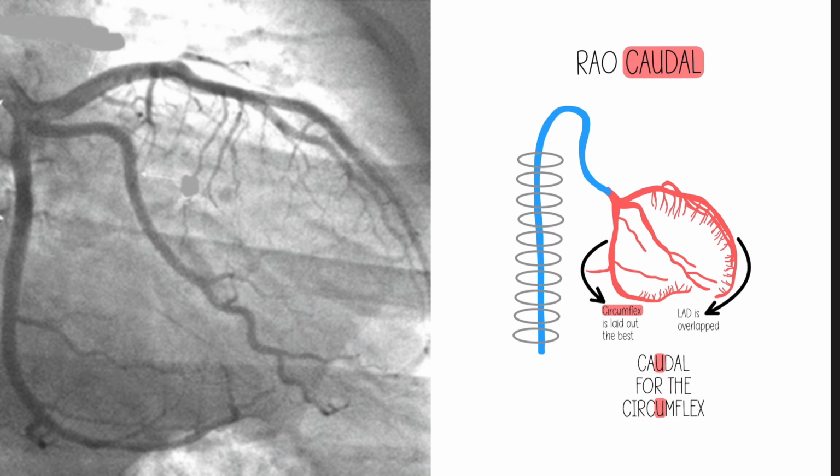It's one of the 4 corners, and this is for the left coronary artery. So again, this is just an animated image first. We've talked about 2 different techniques so far. One you might be familiar with for RAO versus LAO is, okay, spine is on the left, so it's RAO, versus if spine is on the right, it's LAO. So here, this is my version of a spine. Spine is on the left, so it's RAO.